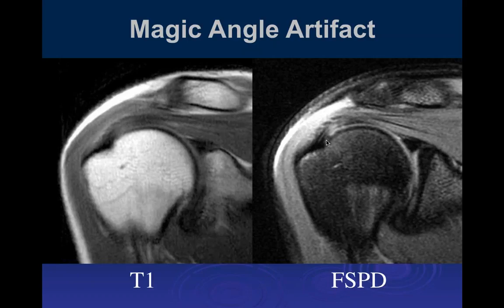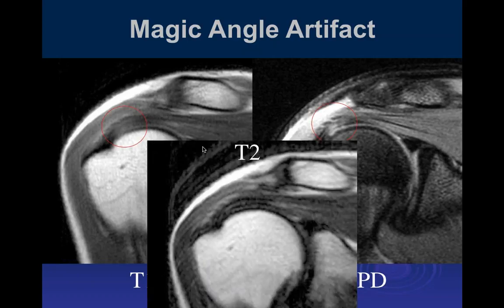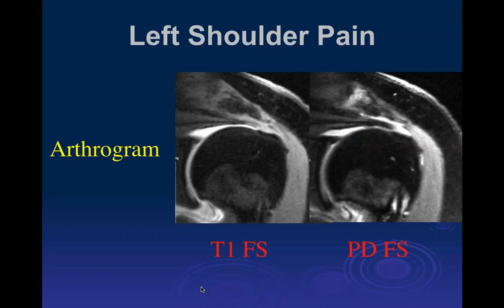That's another reason why I like the T2 weighted images. With a long TE, you don't get magic angle artifact, and it stays dark here. So it helps us differentiate tendinosis from magic angle artifact to some extent. But in general, your eye will, if you haven't already, immediately look at that and just discount it as being magic angle artifact. Here's the T2, which shows the normal fibers going through it without any transverse increased signal intensity, confirming that it's magic angle artifact.